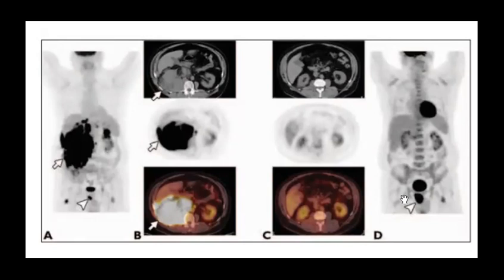So do you agree that RCC takes chemotherapy? Do you figure it like this? Maybe yes, if it is metastatic. But if not, they make surgery, right? Yeah. In most conditions they do surgery. Okay. So let's describe it step by step. This involves the right kidney, and you can see the bones infiltrated, maybe the right adrenal is also involved. Sorry, the left adrenal is involved as well, and all of the right kidney, yes.